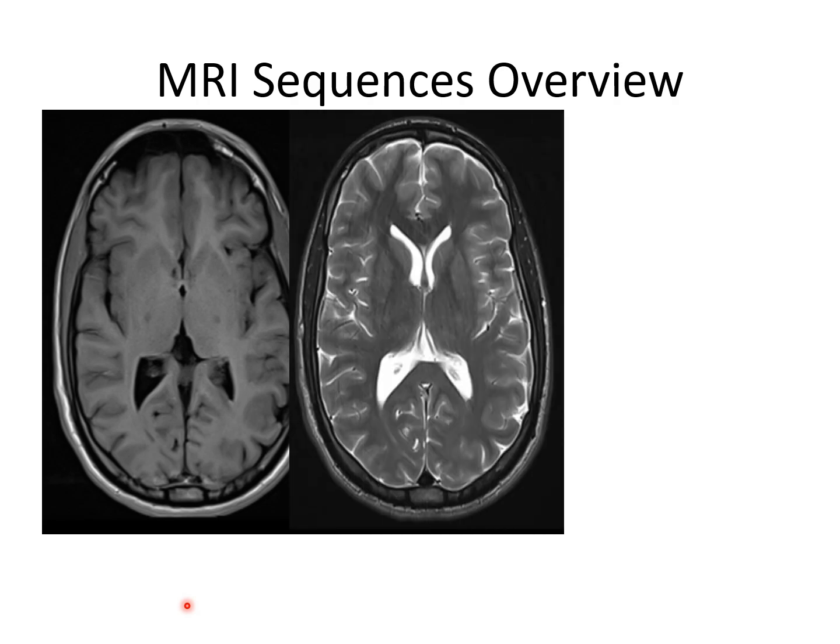Now the second one is the T2 weighted image, in which CSF is bright and white matter is dark as compared to the T1. So we can compare in these two images. This T2 weighted image is best for the evaluation of pathology.